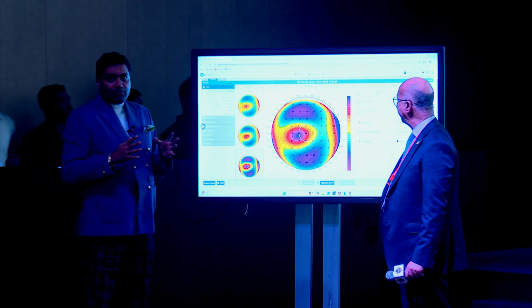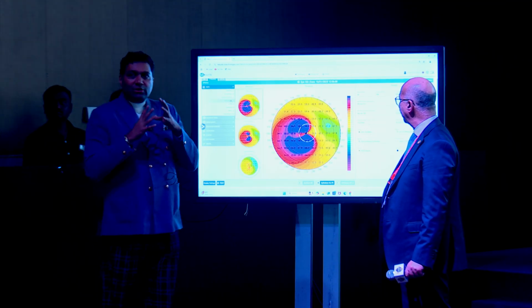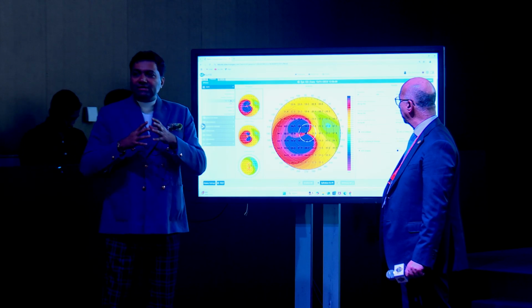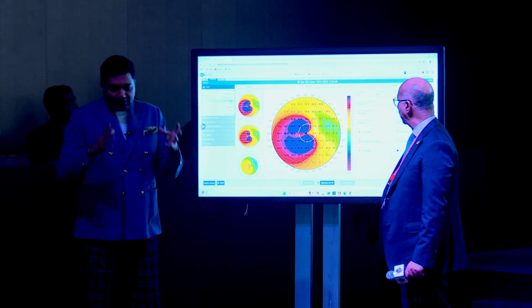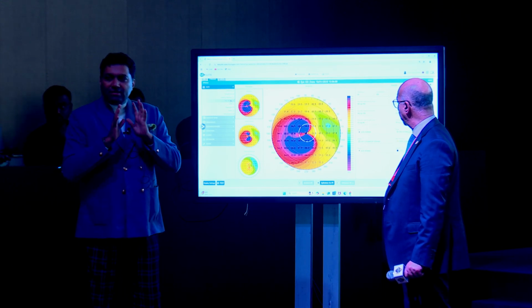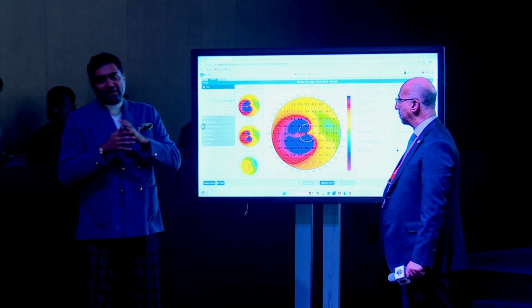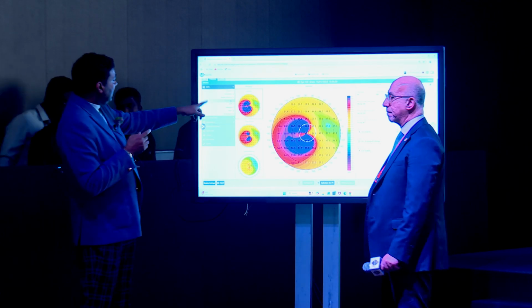The ray tracing is probably one of the most unique features of it. This is not something you have seen in conferences, because he's very particular about giving it to somebody who knows a lot about the optics. So it's not something we very commonly see, and it takes a little time for us to understand. This is how your ray tracing maps look.